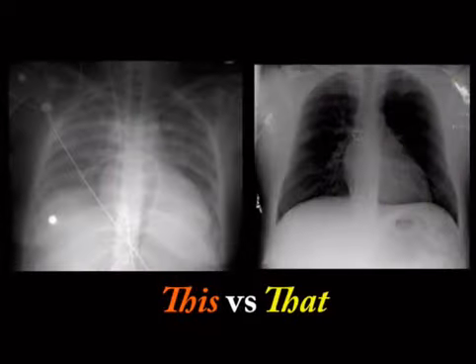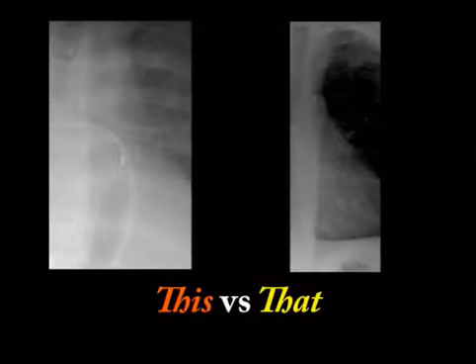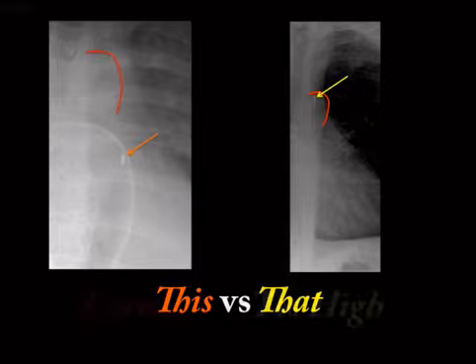All right, let's do a zoom up here. So we've got two cases showing an aortic balloon pump in different locations. This is the aortic knob here for reference. One of them, we've got the catheter down low, and then the other one, we've got the catheter up high. So which one's right? So where is this thing supposed to be?